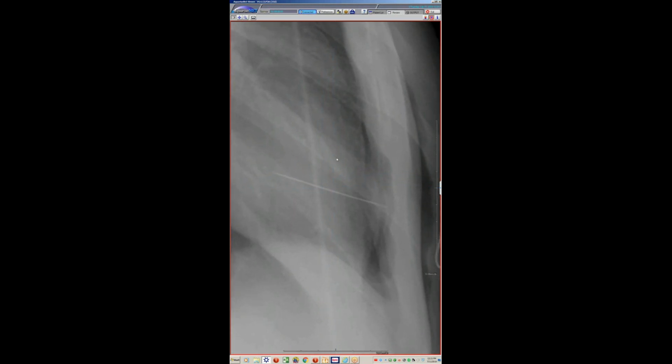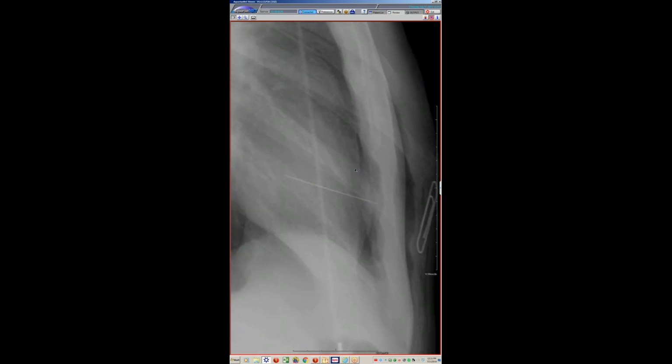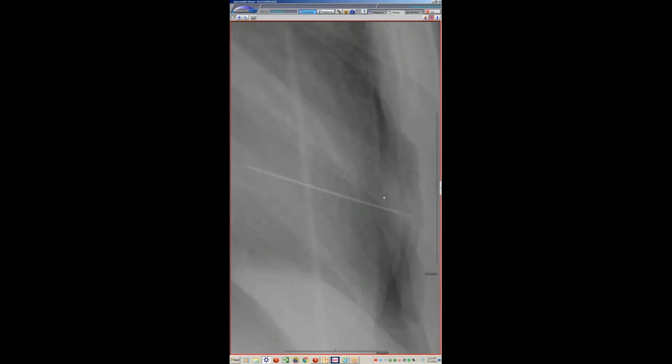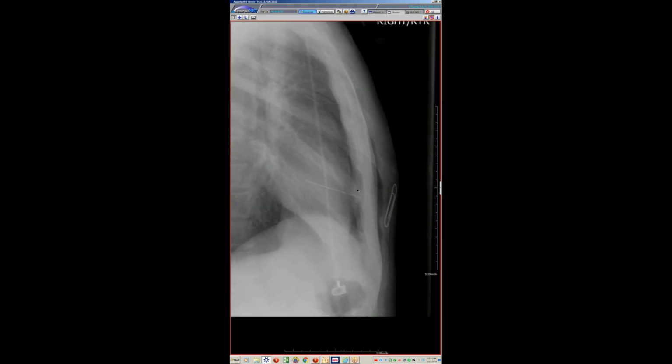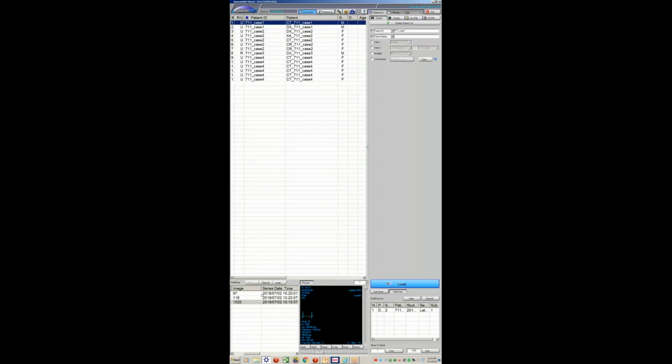And if you wonder how a 3-inch sewing needle winds up in the heart, well, we're all befuddled by that one. You can see the nice little loop if you want to loop some thread on there. Supposedly the kid, an 18-year-old, was walking down the stairs and tripped and fell. And there just happened to be a sewing needle sitting straight up in the carpet, which then impaled him and went into his heart. It was confirmed to be in his heart on surgery, but I don't have any pictures. A nice case of a needle in the heart.